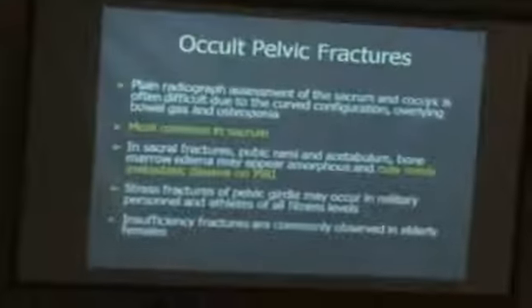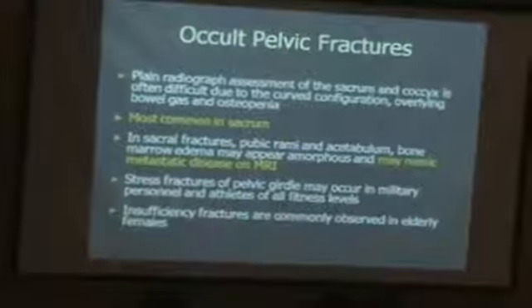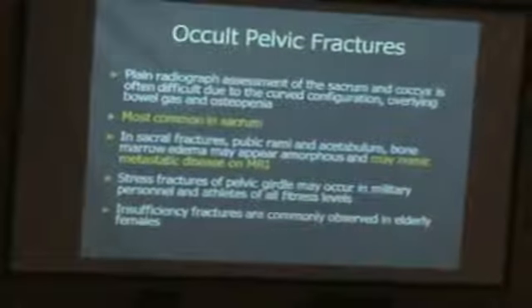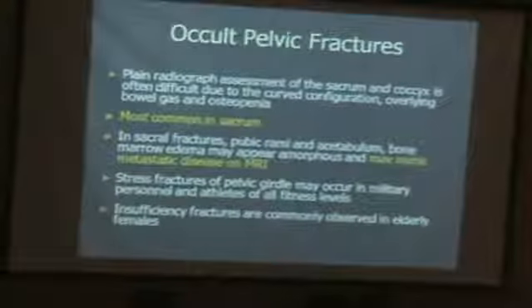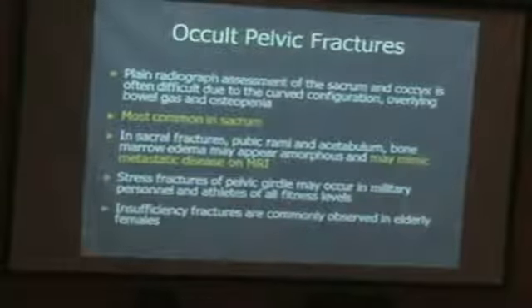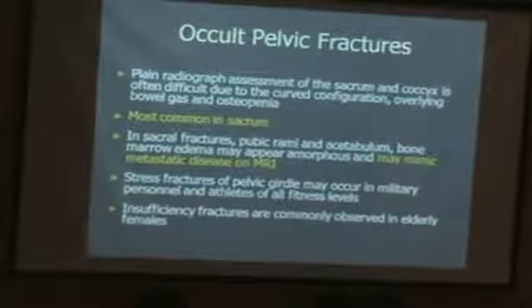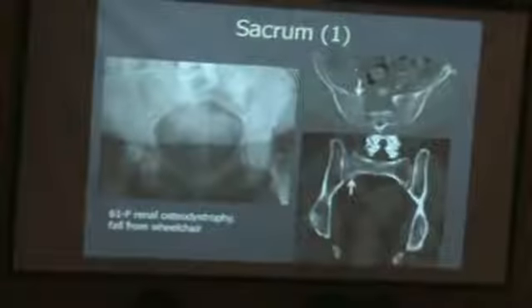The sacrum is maybe the location that you're looking at, and that's, as I said, very difficult. You need to be aware that these stress or insufficiency fractures are very difficult to assess on an X-ray, especially in postmenopausal females. So I'll show you some examples.